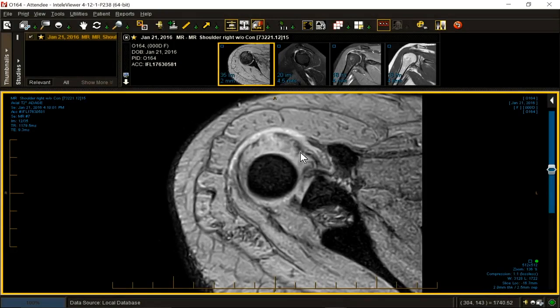That's a good word, right? And then you could throw in another adjective, like mild, moderate, or marked. How about moderate to marked confluent? And then we have to say confluent what? Tendinopathy, hypertrophic tendinopathy, hypertrophic tendinopathy with intrasubstance tendon fibril failure. All of those would work. They work for me, so I hope they work for you. Let's keep going, shall we?